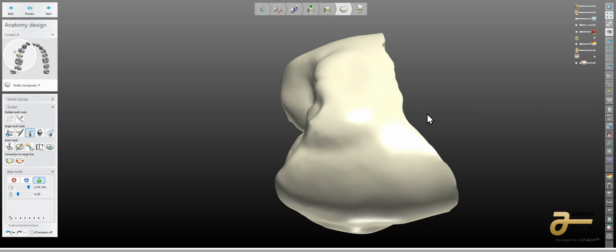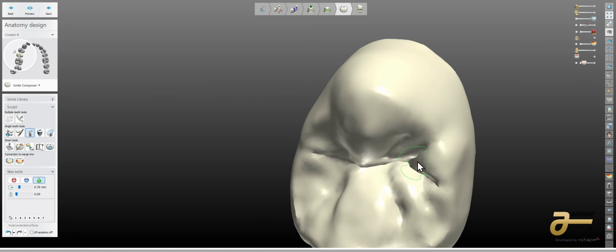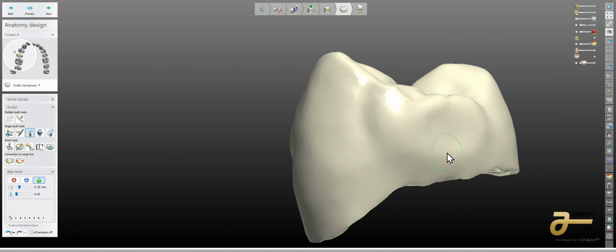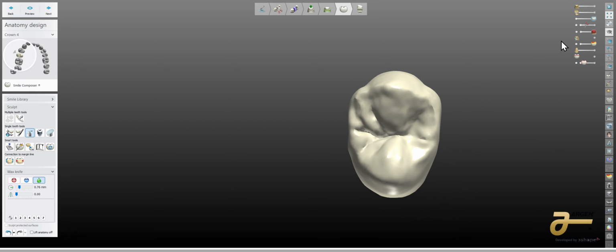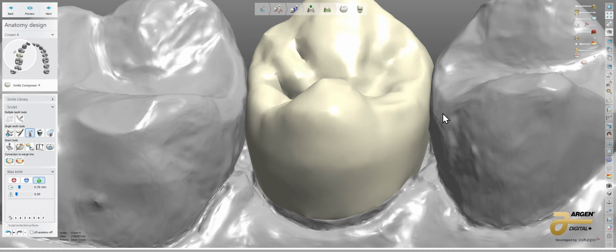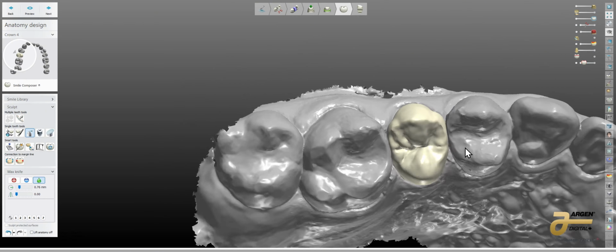There's a big thing about that for the contacts to be easy. The idea is to make the delivery on these really predictable and simple. We're going to add some thickness in glaze when we're doing this. And if we're leaving concavities like this, the tooth is going to wedge. And very often when the temporaries aren't managed properly, you're going to have a light contact. But you can see right here at the height of contour, I have it coming down, I have it coming down. All those things are super, super important.